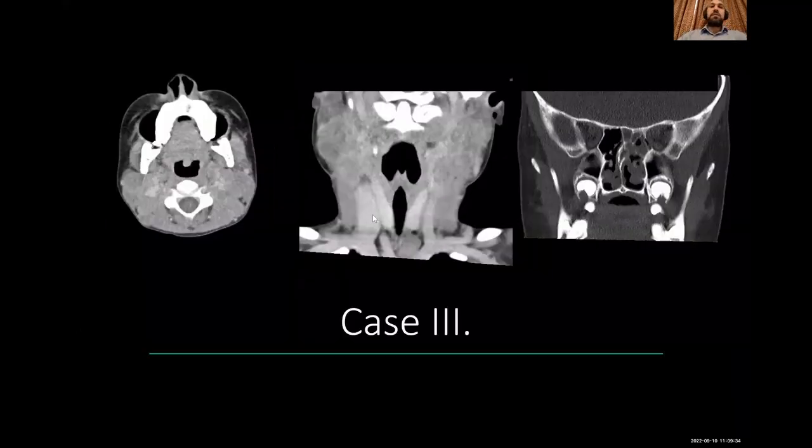Okay, next case: multiple cervical lymph nodes, sinusitis.